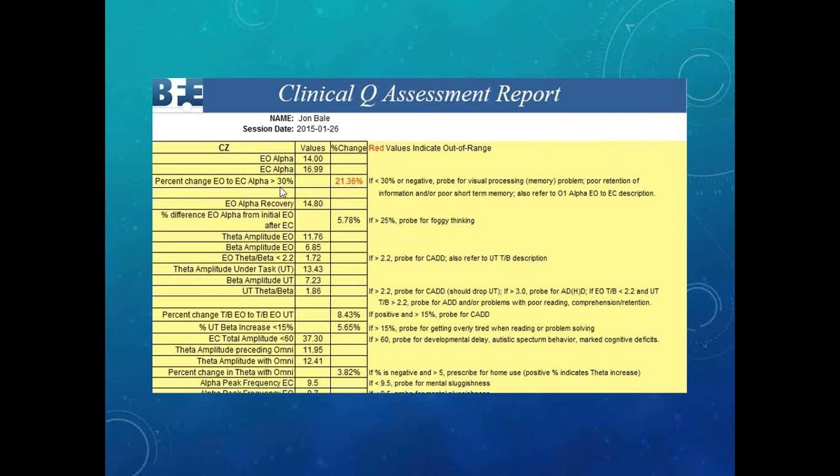You get a result with a lot of different statistics. Since I'm used to looking at this, I can make sense of these numbers and interpretations, and I know how to move forward and what to discuss with the client.